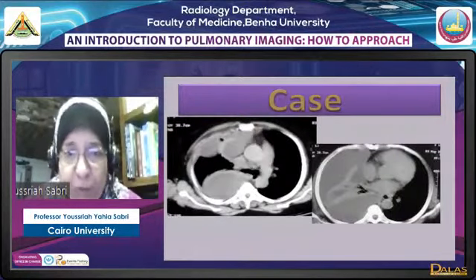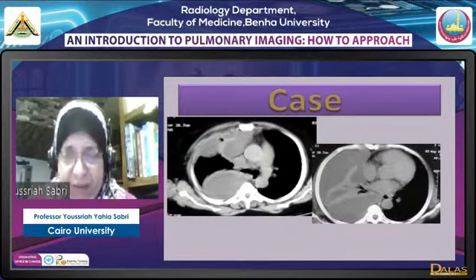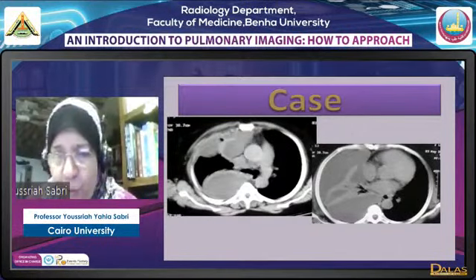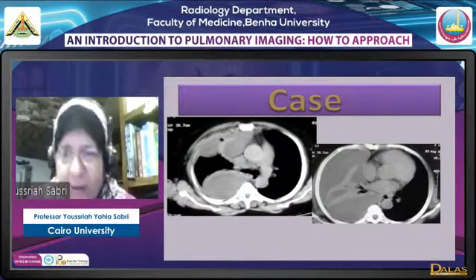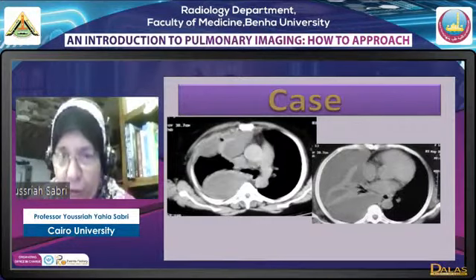Now here we have two images of the same patient. Of course, the right side image, as you can see, has loculation, which is so clear, and even a dense pleura, while the remaining effusion basally is free. This is something that you see a lot: partial loculation of an effusion.